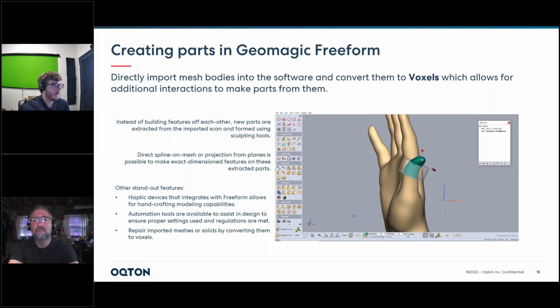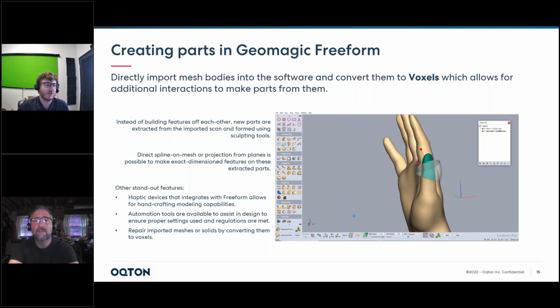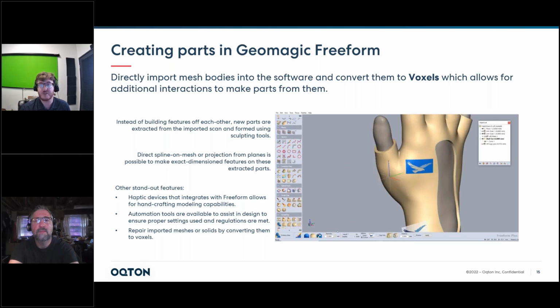So, as David mentioned, a lot of Freeform is particularly great for the fact that you can really manipulate and work around that scan data. It gives you that live feedback as well, so you can make different little changes. You can sketch around it if you want those parametric, exact dimensions, like David said, oh, I didn't make it thick enough, I can edit that up real quick. It's not lost. You don't have to restart from the beginning because you are working in a digital realm.